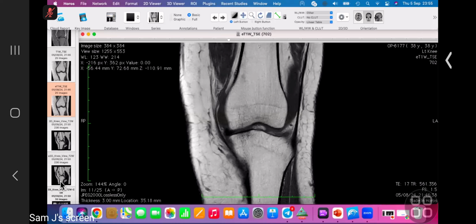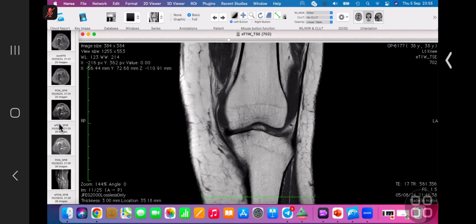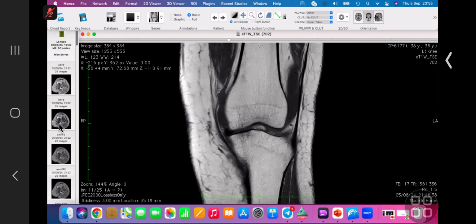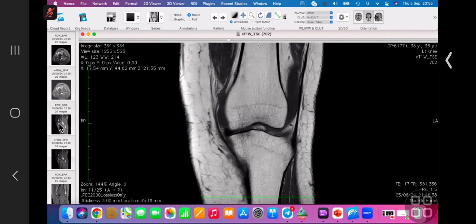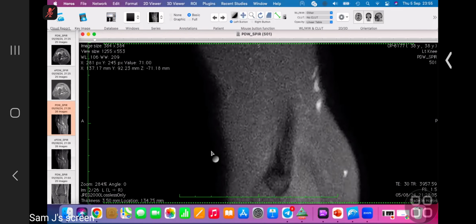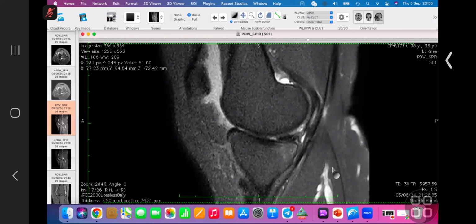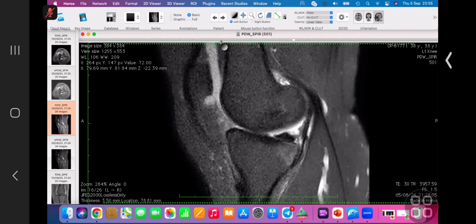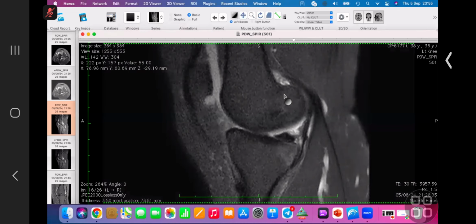So yeah, you have summarized well. Yes, you did pick up that medial meniscal tear, but I wanted you to look at it again. So let me show the findings. So why did I put this case? It's very critical to inform the orthopedic surgeon, especially because you need to do surgery for these cases. So post trauma. Yes.